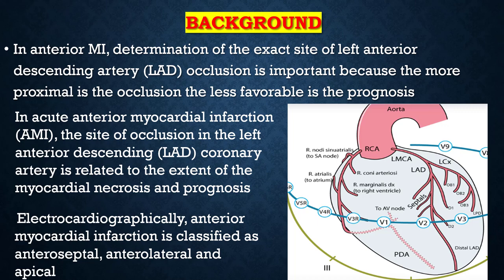Electrocardiographically, anterior myocardial infarction is classified as anteroseptal, anterolateral, and apical.